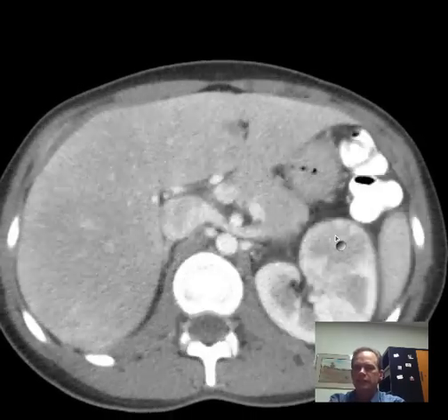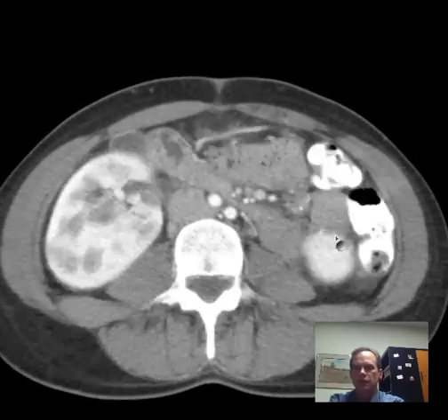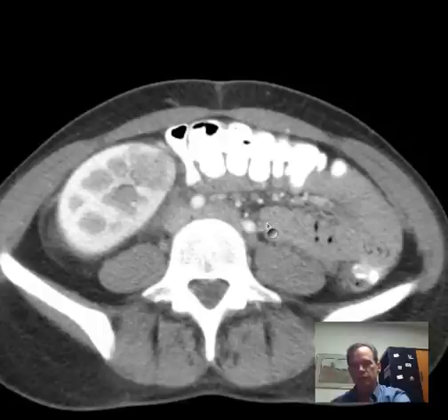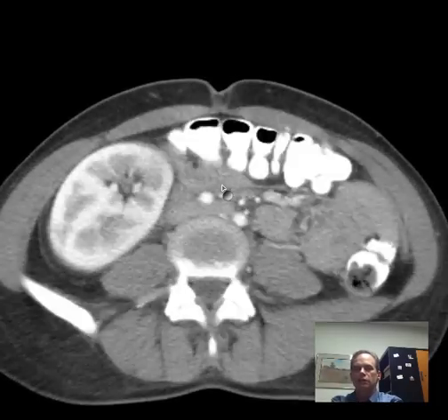Pyelonephritis is a kidney infection, very often bilateral. That's what you're looking at here. This is a classic, typical appearance of pyelonephritis. We didn't used to be able to diagnose this very easily by imaging, and it was almost always a clinical diagnosis. The urine specimen would have white blood cells in it, often red blood cells as well, some bleeding related to the inflammation, and they would be able to grow, if not immediately see, bacteria in the urine.